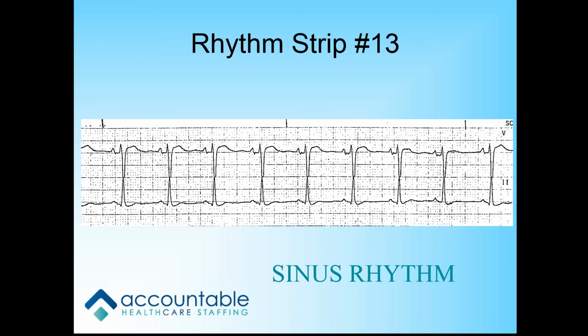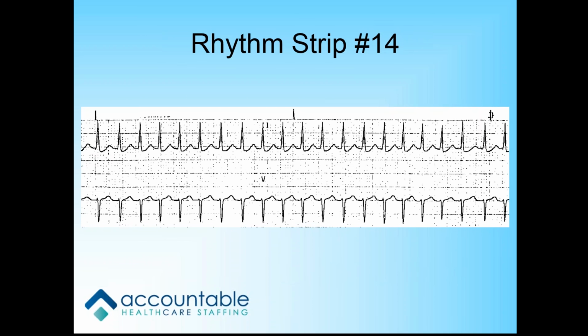Next. Eleanor? Yes. Okay. Let's take a look at this guy. All right. What's that rate? It's fast. I mean, was it 220? Did I count that right? Yeah, you did.